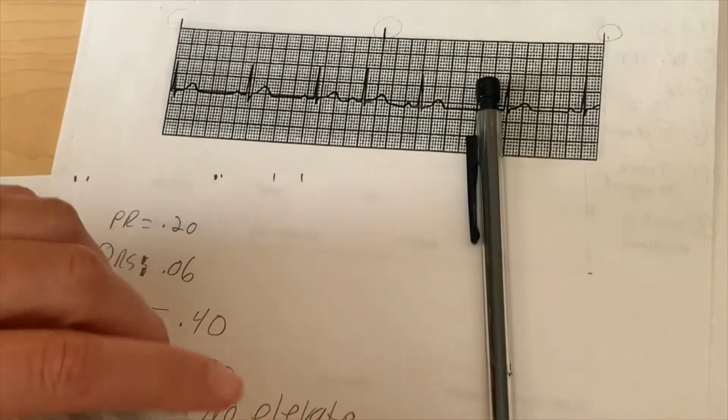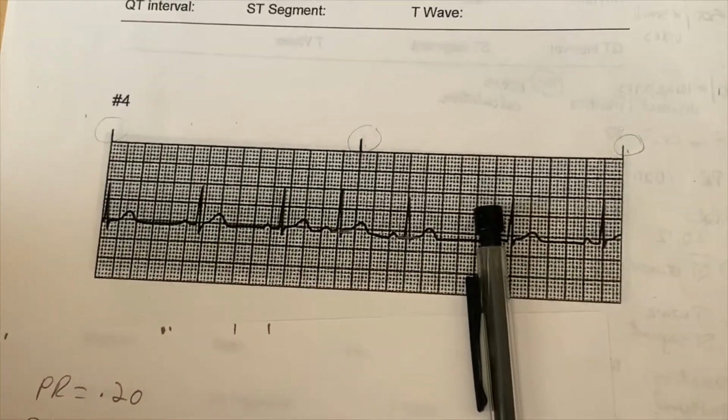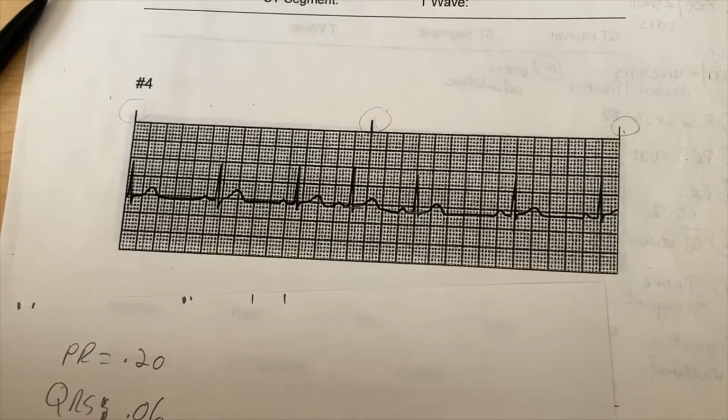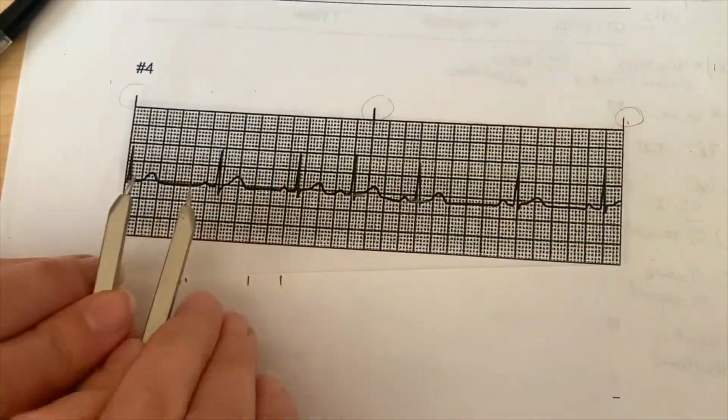We are just going to briefly do kind of the same thing, but with a caliper in case you have some. If you don't have a caliper, they are not required. Please just use the paper method. It's what I spent most of my life using is the paper. If you happen to have calipers, they've got little pencil points on the end.